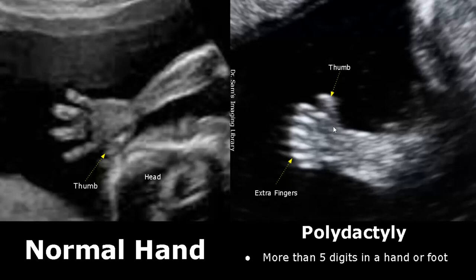This is a case of polydactyly. In this condition, there are more than 5 digits in a hand or foot.